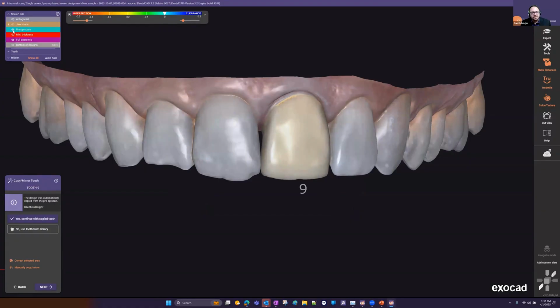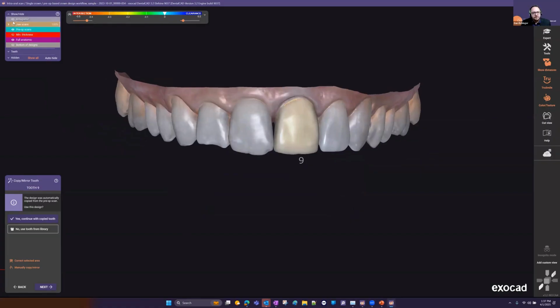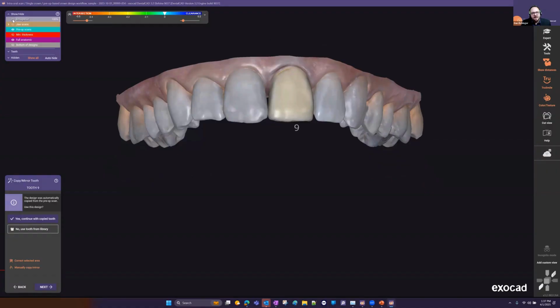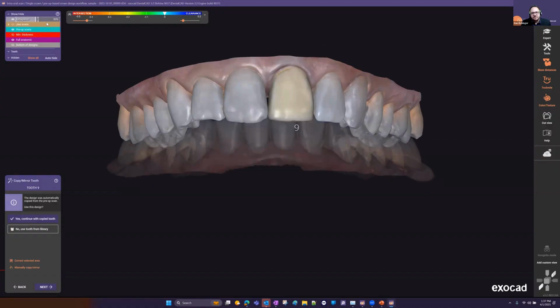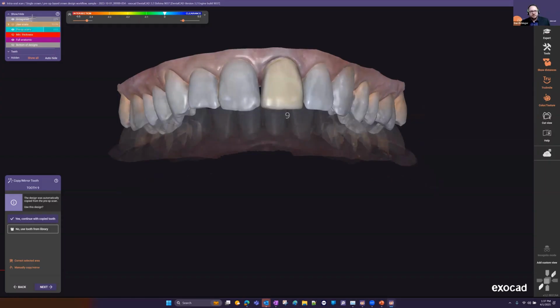And you can also see in what we call the show hide menu. This is going to control the visualization of your meshes. So you can see antagonist is automatically turned off at this step. You can turn it back on with clicking on that eye icon. And you can left click and drag to change the transparency of any object within the show hide. One thing to note with the show hide, as you're proceeding through the workflow, there's new objects that are going to arise in that menu.